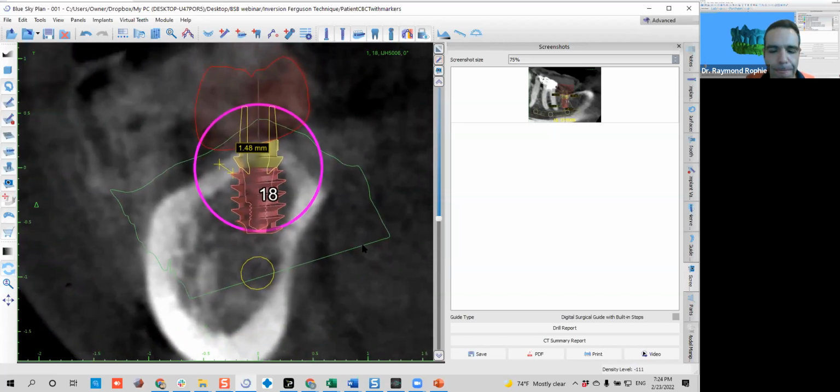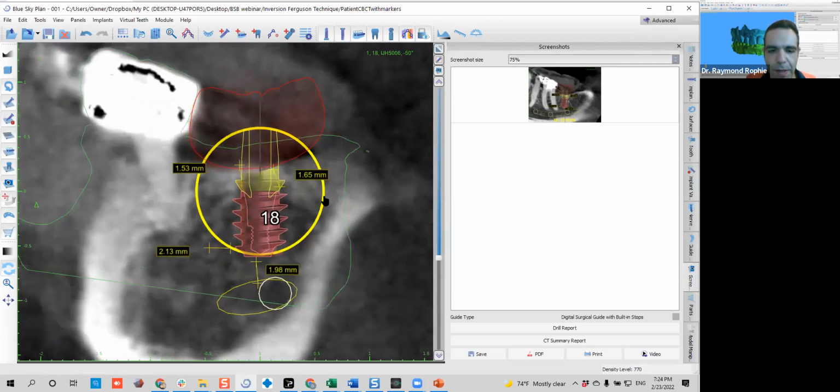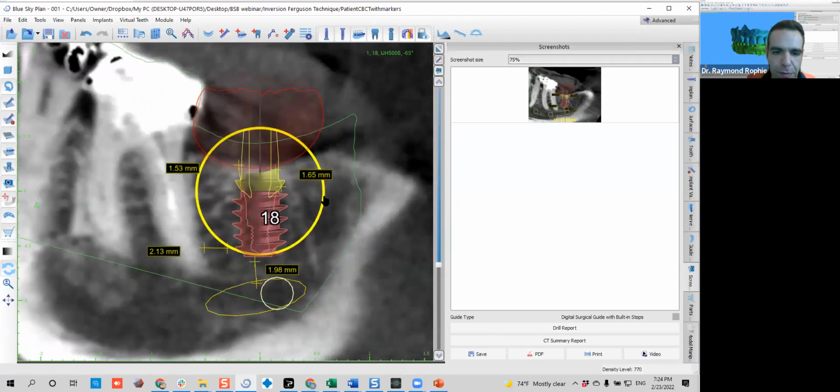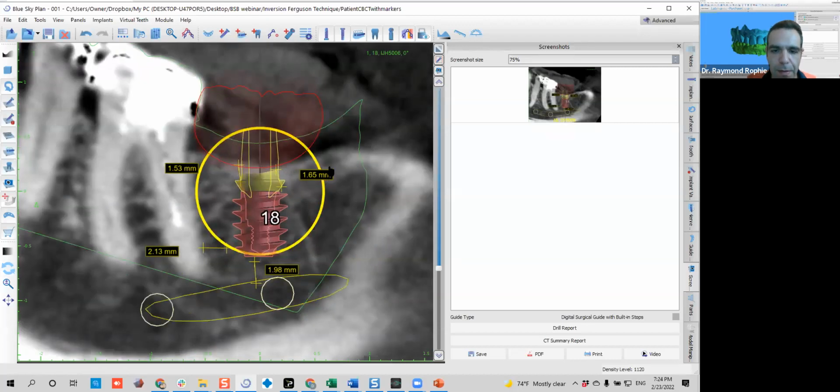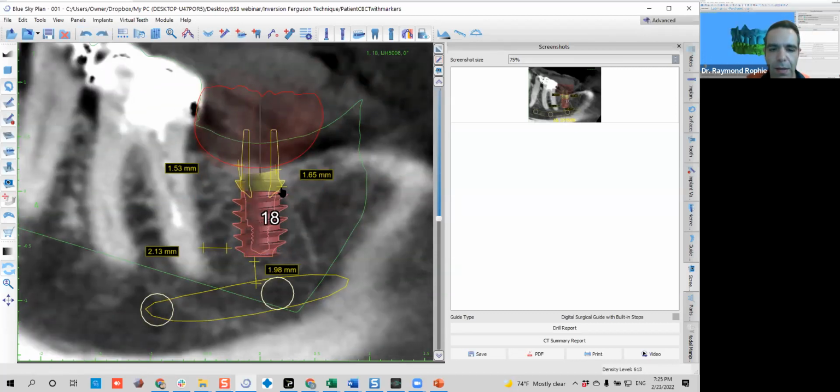Okay, so again, I will look for the area, scrolling, where my measurements are, which is right here. Oops. If I did a movement that I didn't want to do, I just click undo, like this time. And here, if I want to remove this ruler, right click either on the number or on the measurement, right click, remove, and trace again.